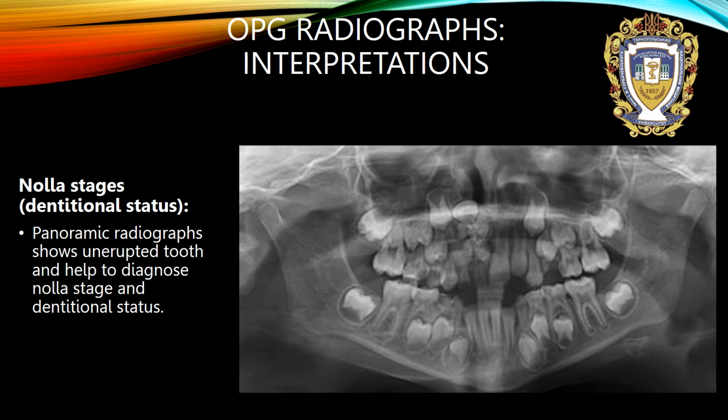First, we need to describe the dentitional status, Nolla stages. Panoramic radiograph shows unerupted teeth and helps to diagnose Nolla stage and dentitional status.